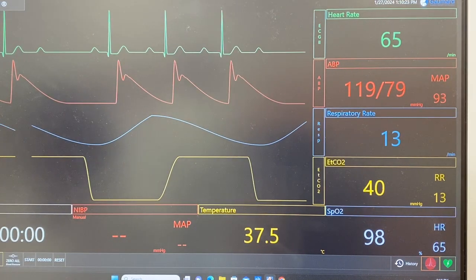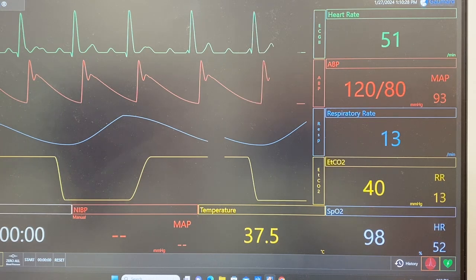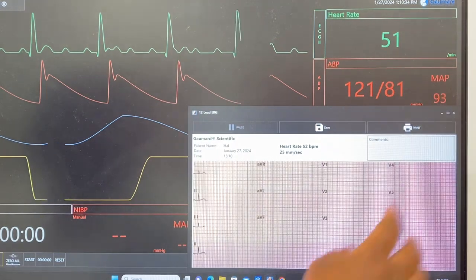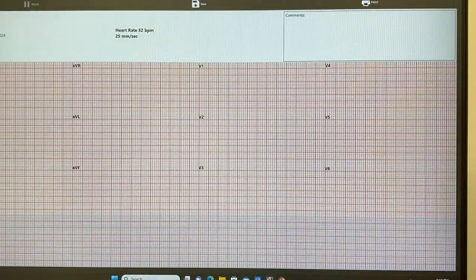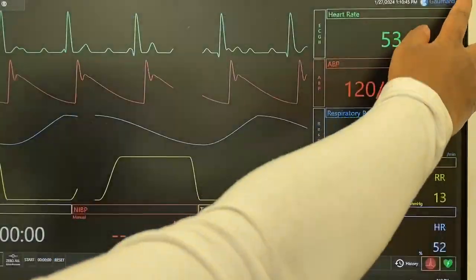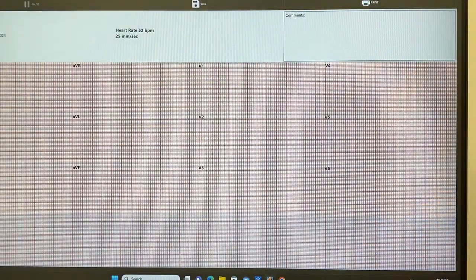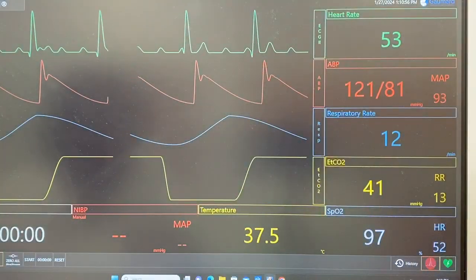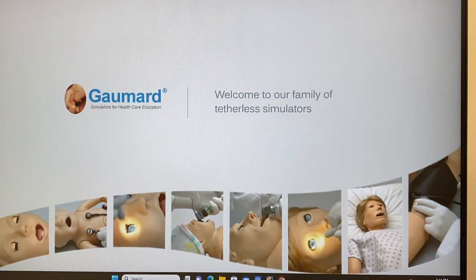All right. Okay. Exit out. Come back. The computer is tired. Exit out. We're going to reboot it. Okay, and then click on the little baby icon at the bottom here.